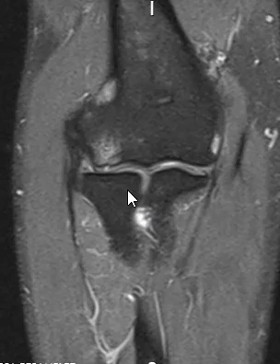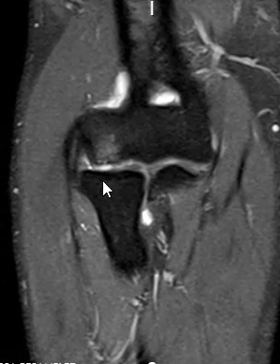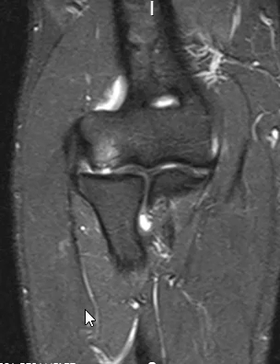This is an image that shows that halo of marrow edema, that small defect involving the cortical bone and the overlying cartilage. On this view here, you get a sense that the cartilage is absent. And over here, you can see some cartilage, and here there's a fluid signal, so cartilage is absent. We also have a STIR sequence that shows us a little bit better here. So we have an osteochondral defect of the capitellum with surrounding marrow edema and a very small joint effusion.